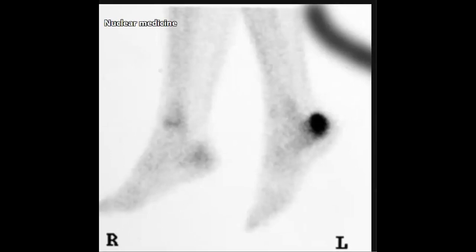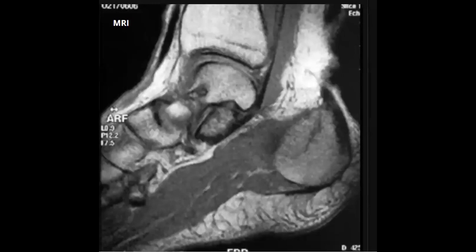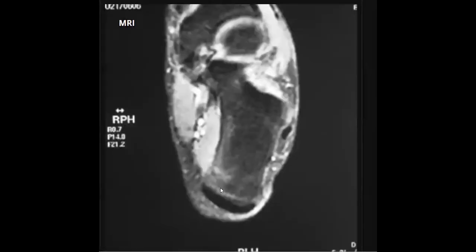And in such case, you have to mention that you will correlate with another study. Usually it's X-ray, but in the stress fracture, usually you will not find any abnormality on X-ray. So usually go to the MRI, which is more specific to catch the stress fracture, which is a frequent question in the exam. So let's go to another bone scan.